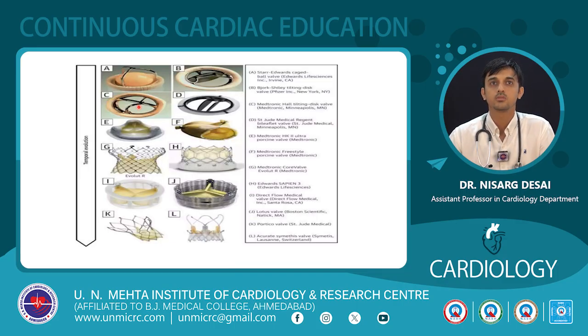So just to brief it up, valves from A to D are mechanical valves, and E onwards are biological valves. The main difference is A is the traditional, no more used Starr-Edwards caged ball valve, and B is a Bjork-Shiley tilting disc. B and C are both tilting disc, both are from different manufacturers, and D is the one that is commonly used, St. Jude's valve.